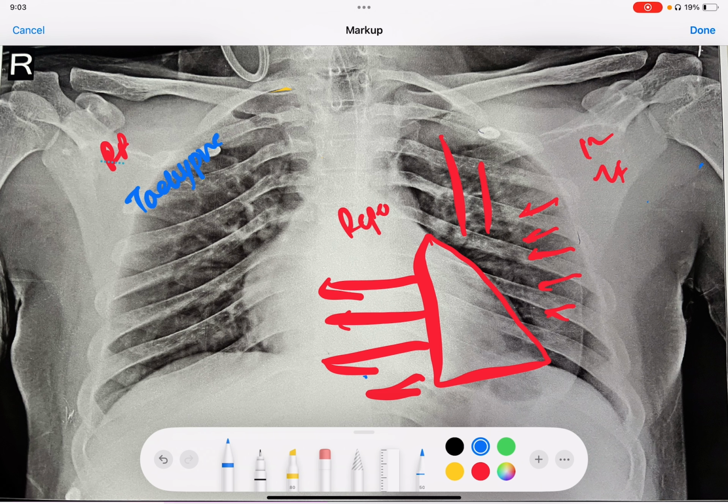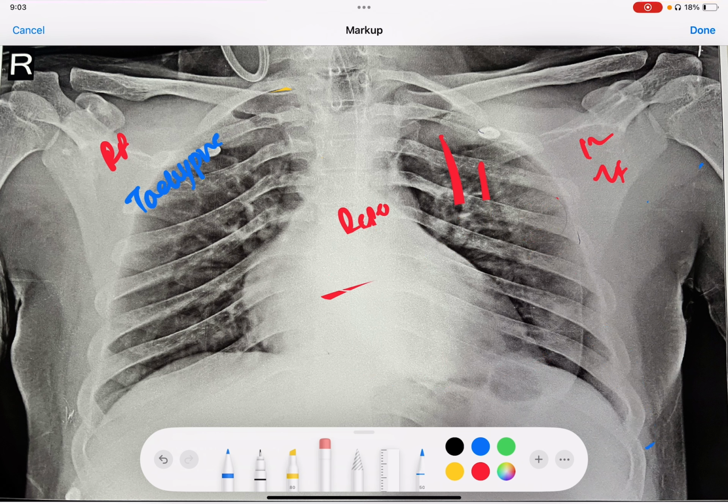Patient may need ventilation or NIV or invasive ventilation. And most of the time, simply putting an ICD, intercostal drain, will resolve this issue. So this X-ray very typically shows a very beautiful pneumothorax that was post pleural effusion tapping. That's all for now, and thank you.